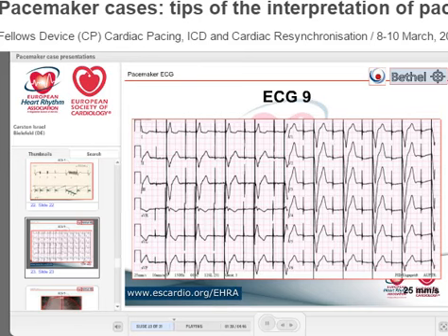It's a long AV delay of approximately 200, I don't know how much, it's 8 times 4, 300 milliseconds, a little bit long. And then it's left axis deviation. QRS width is around 180 milliseconds, QT is around 380, and there are no intrinsic atrial or ventricular beats, no arrhythmias. So far, so good.